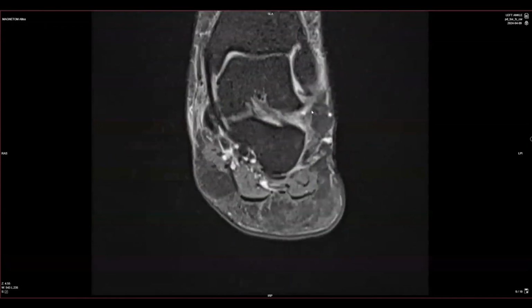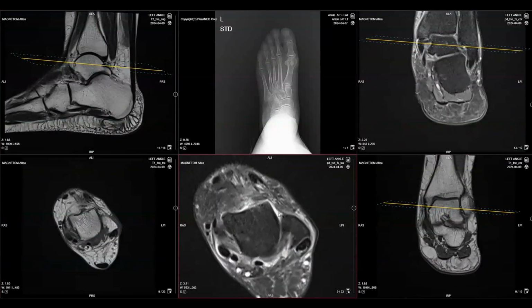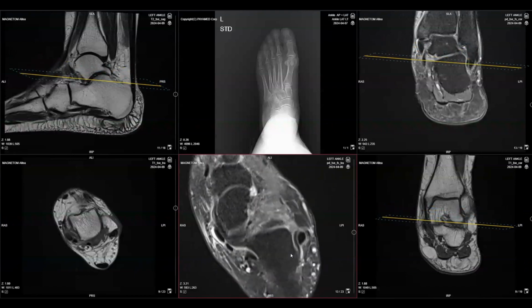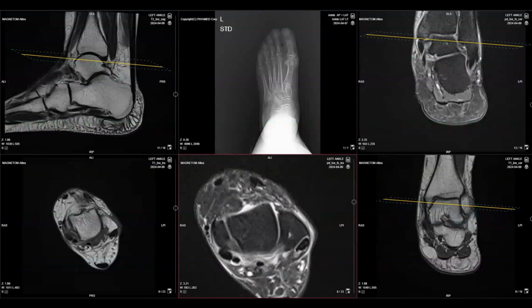Yeah. So moving from those ligaments and the sprain of those ligaments, let me just get back to, so I would call this ATFL sprain, partial tear, periligamentous edema, that's subacute on chronic. PTFL, subacute on chronic, calcaneofibular ligament, and lateral talocalcaneal ligament, subacute on chronic with synovitis. Now let's get to the ropes.